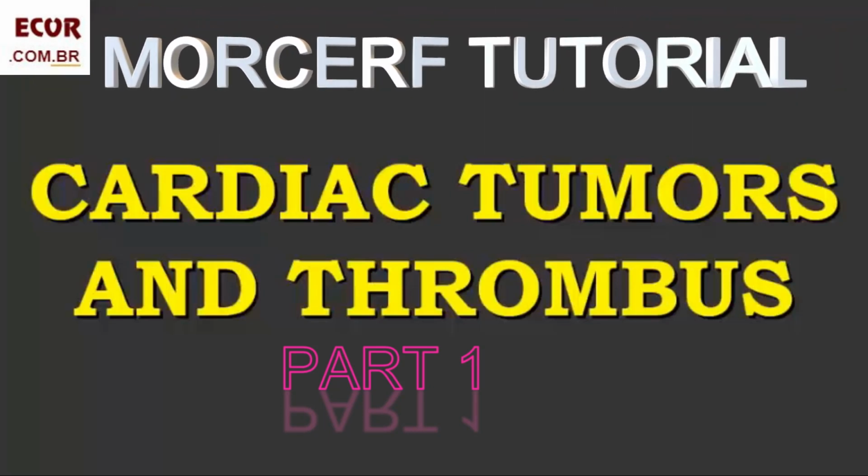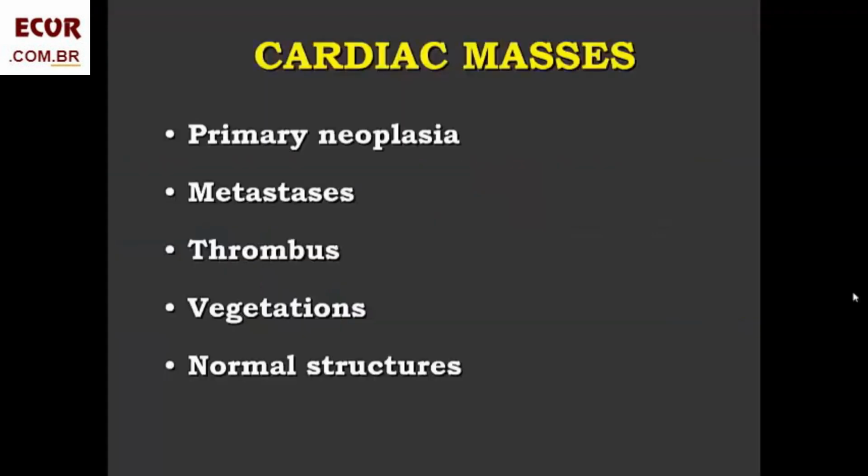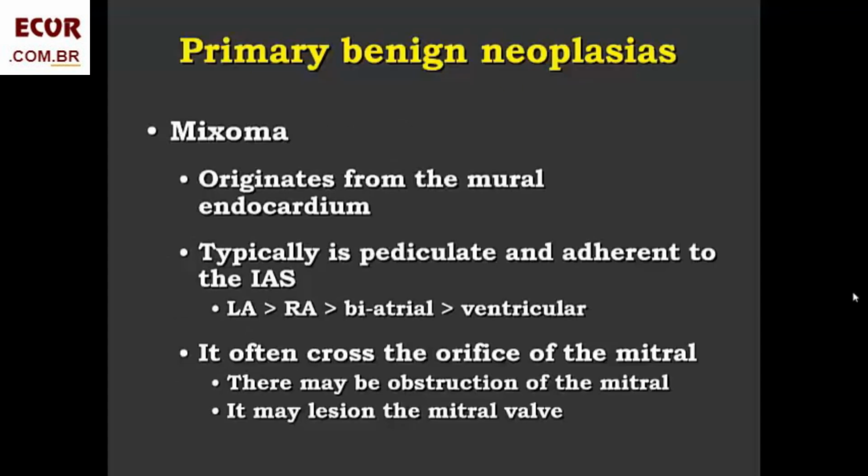The subject of this talk is cardiac tumors and thrombus. Cardiac mass may be primary neoplasia, metastasis, thrombus, endocarditis vegetations, and frequently normal structures that may simulate abnormal mass. Let's see them all. To begin with, the primary benign neoplasia, and the most frequent of them is the myxoma.